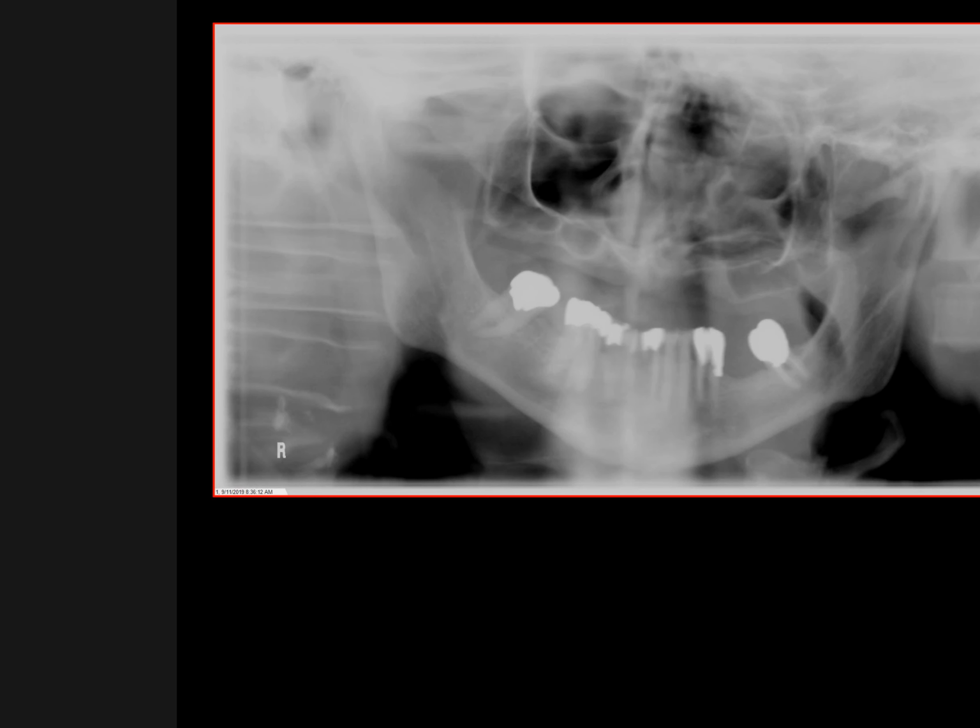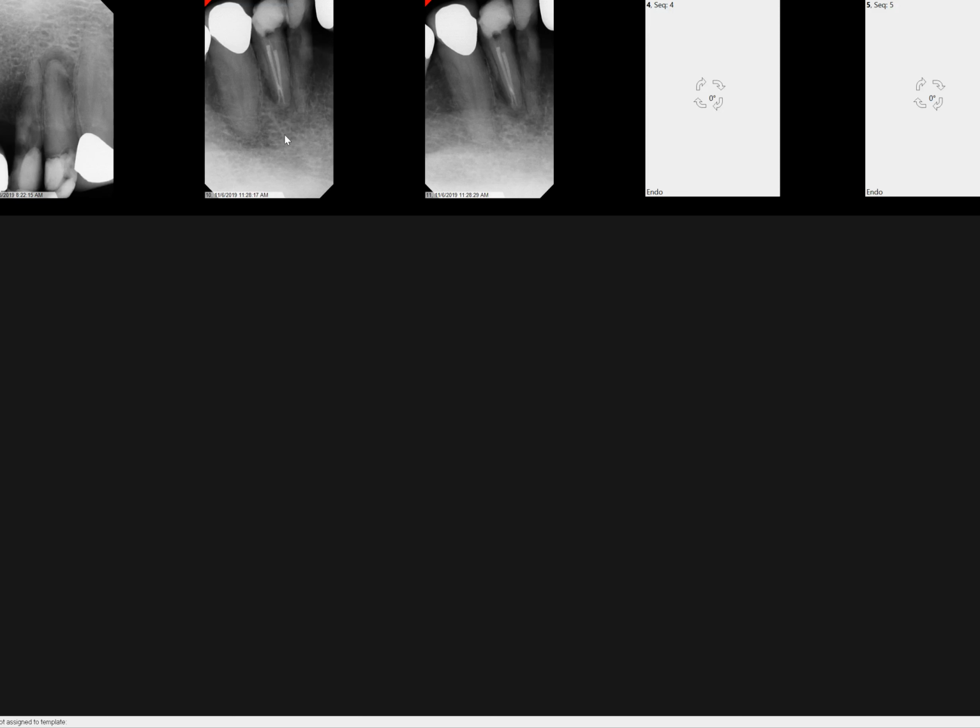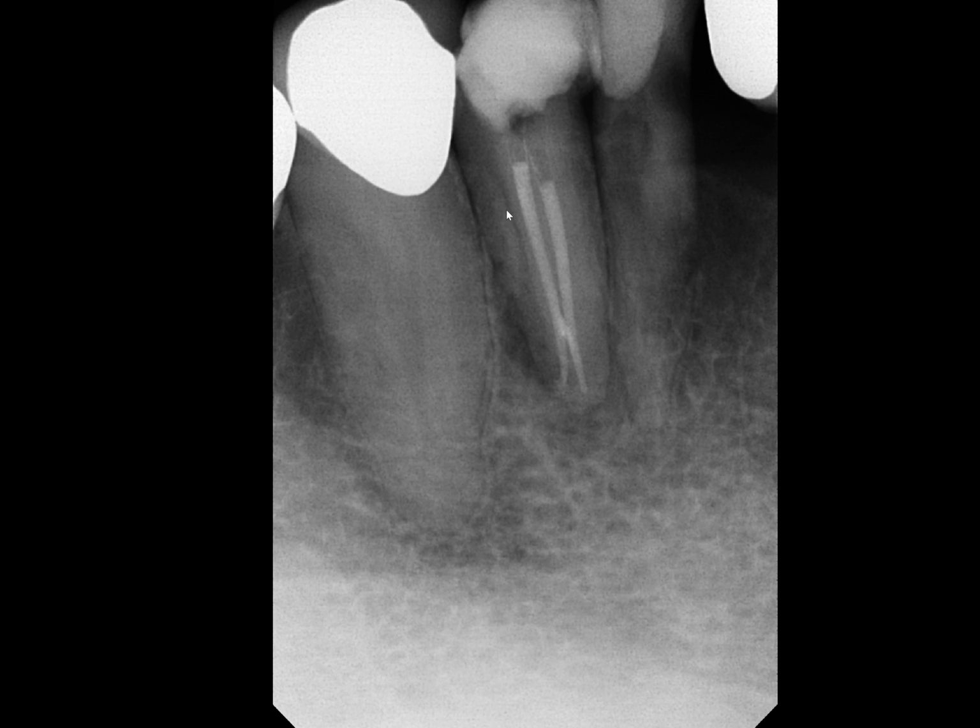So then they completed a root canal therapy on tooth number 26. This tooth, the lateral incisor, had 2 canals, and they did a root canal therapy. What's interesting here is that this was taken, I think, a few months after that first PA that I showed you. At least from this radiograph, it doesn't appear perhaps as radiolucent as the other one, but also now we're seeing radiolucency, or better visualizing radiolucency that's on the side of the root. So it's quite interesting, right?